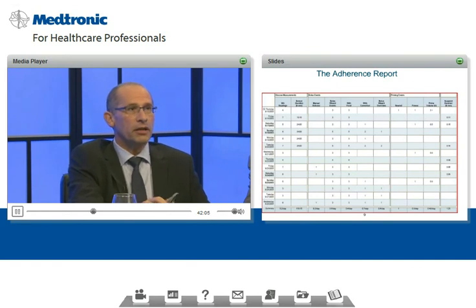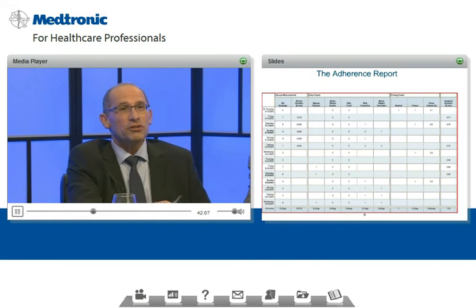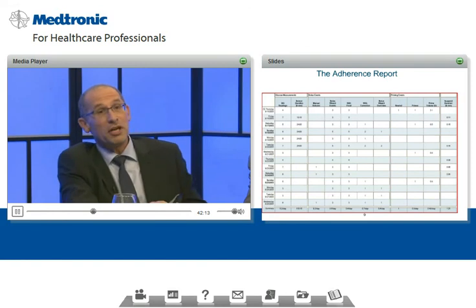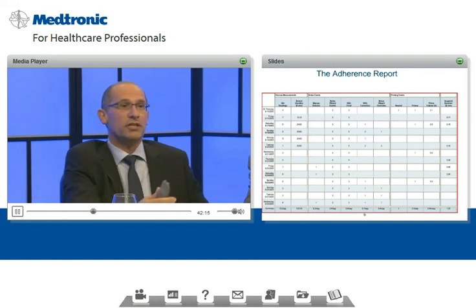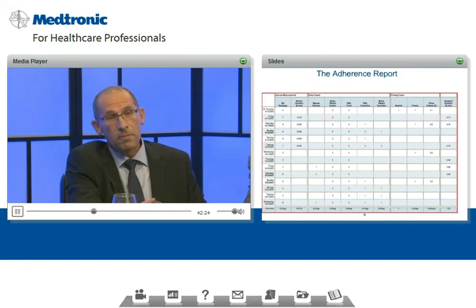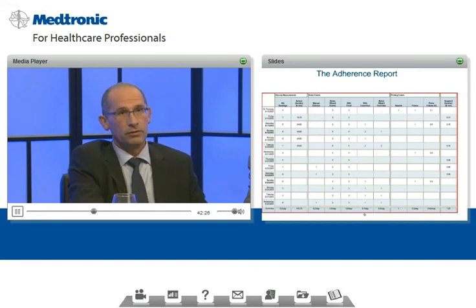But on the other hand, if the patient does not do any overrides, that means he automatically does exactly what the wizard does. It's also not the best policy, because maybe he's not using some of the sense of what's going on with his life when he's bolusing, because some of the information is very subjective. Is he going into sport a couple of minutes later? Is he feeling well? And so on.